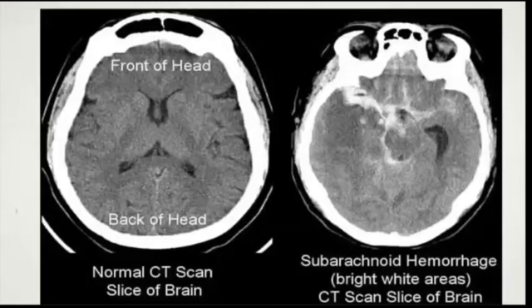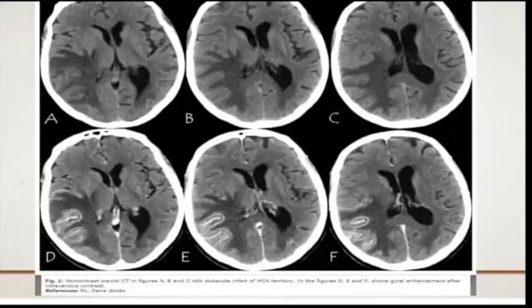So here are some other images. This image here is a normal brain CT. Again, appreciate the sulci on both sides. Now start looking here, start seeing whiteness in here, whiteness surrounding in here. And then you start noticing this patient has some sort of hemorrhage within their parenchyma. Now we're mostly looking here at a subarachnoid hemorrhage.